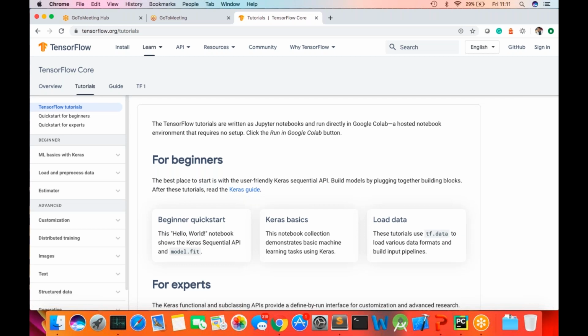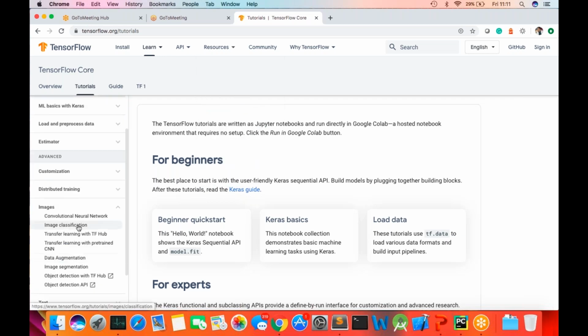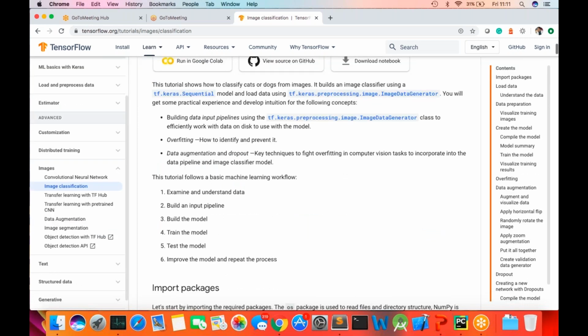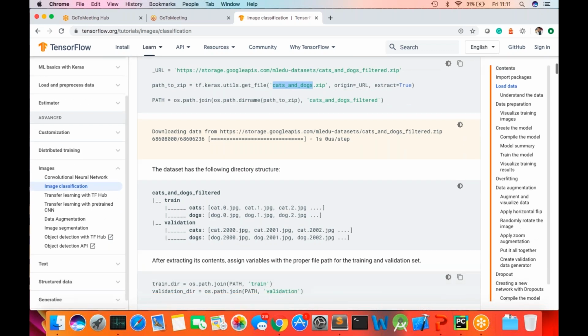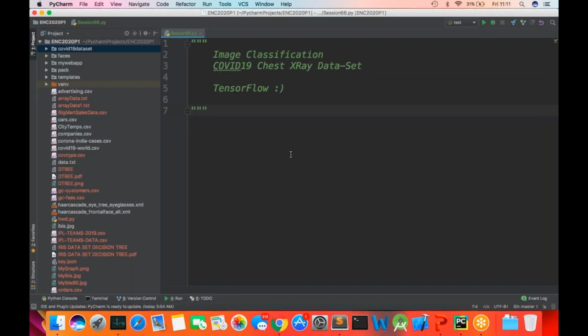I don't know how many of you did it. We'll use a similar approach, but Google worked on the cats and dogs data set, while we have a different data set and a slightly different way of dealing with it.